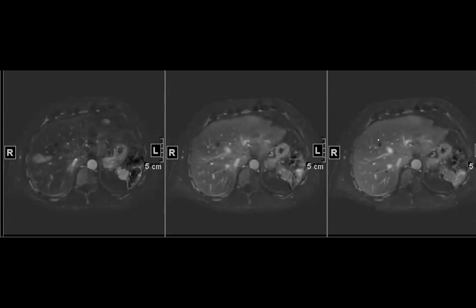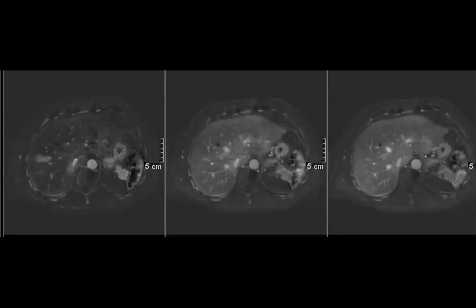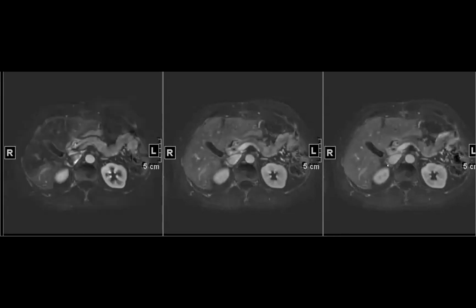At first I thought maybe this is just a weird hemorrhagic cyst, but then they look very different on the delayed. I don't know. So they're probably mets, very high chance that they're mets, but it's a very unusual appearance, and I didn't have a good explanation. Yeah, I don't know, maybe just super necrotic, but you said they were new, right?